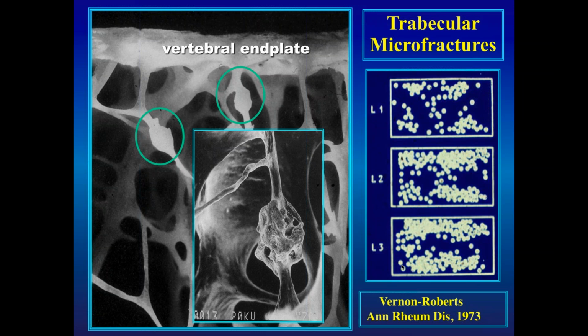One might also consider this to be attrition, as we see remodeling of, for example, the tibial plateau in the presence of osteoarthritis with cartilage loss.